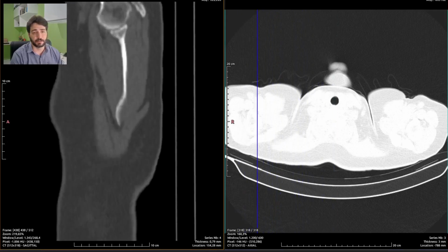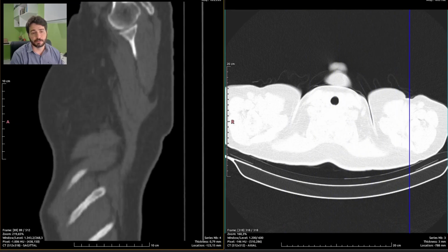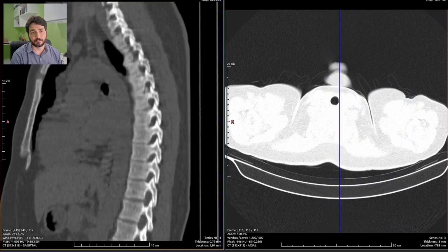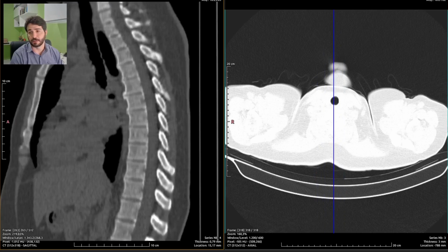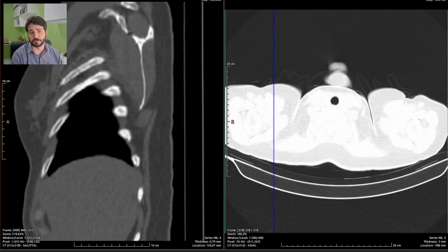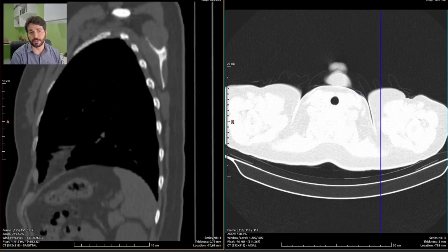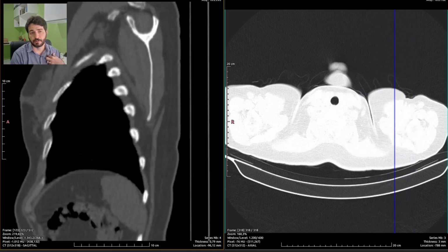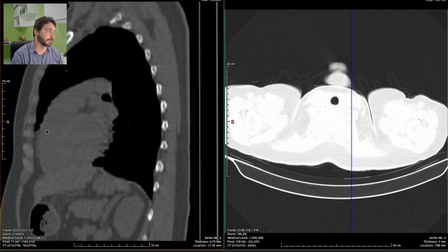Patient is quite young, but it seems she is suffering of some kind of back pain, because this ought to be painful, at least in some sense, in some situations. Rib cage seems fine, as much as we can tell on this kind of exam, and there isn't much to tell. This case isn't much at all, so just report.